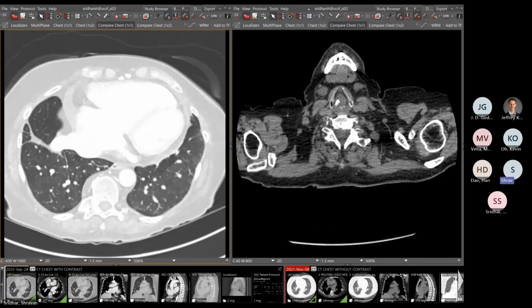There are case reports of this very rare finding called an accessory hemidiaphragm. Apparently, when they repaired the scimitar vein in this particular case, they found a fibromuscular membrane that contained a little bit of diaphragmatic tissue and almost simulated the diaphragm. Could you show us that in coronal?